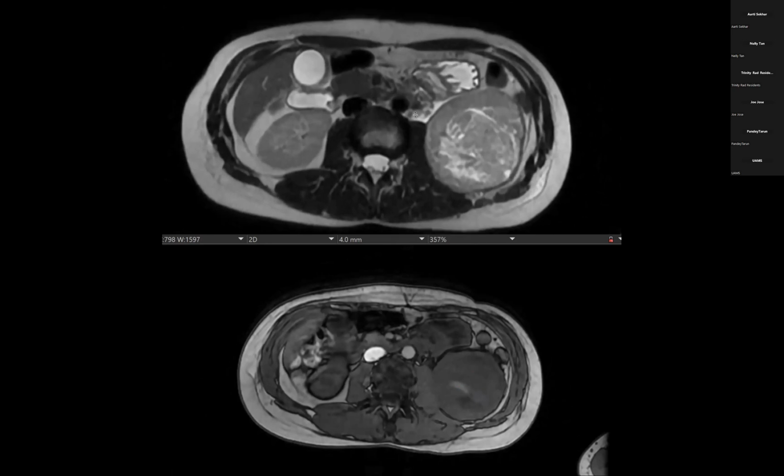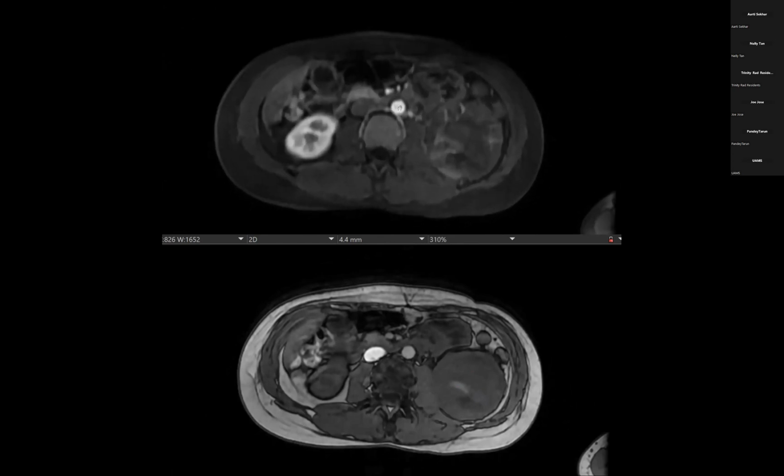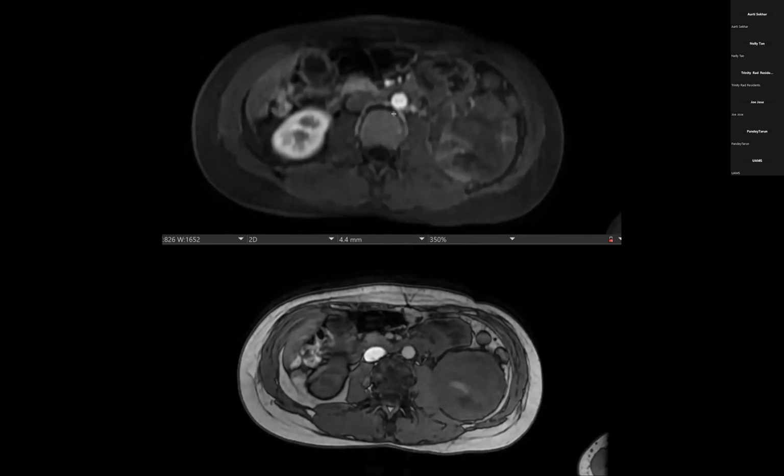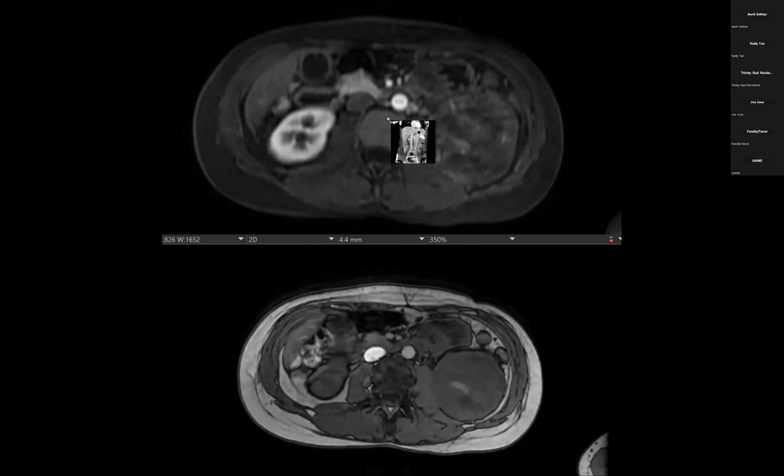It's not a good look for lymphoma, and they have enhancement like clear cell renal cell carcinoma. This one is hypoenhancing. That's another reason why it doesn't look great for lymphoma. Poor, either, and I don't see other lymph nodes. Agree. Yes, to all of the above.